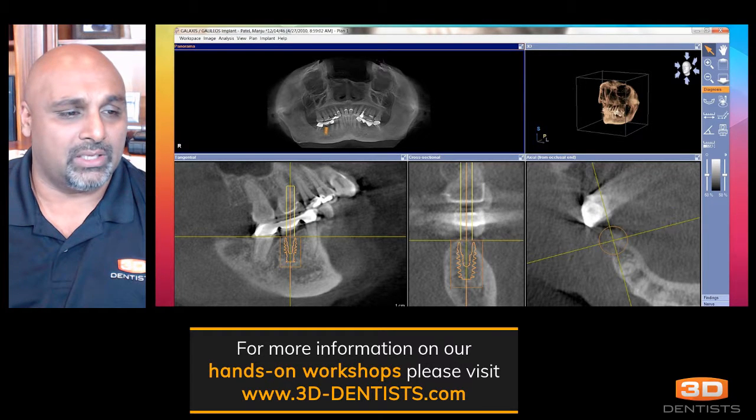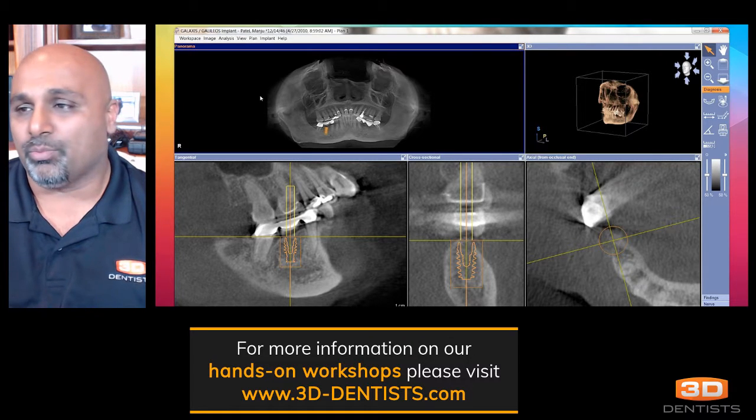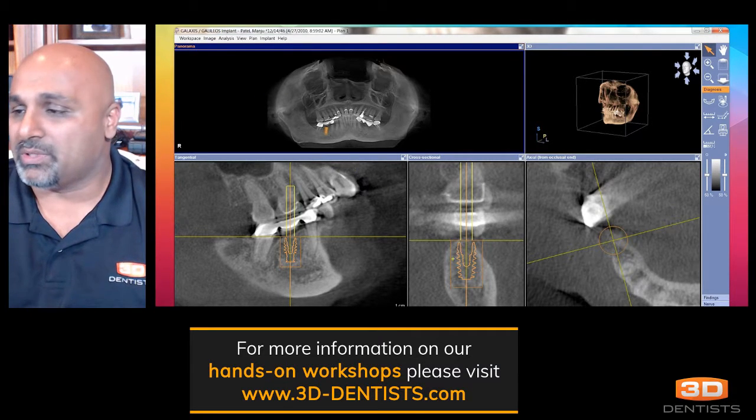Oftentimes we look at this from a singular perspective, and in looking at it in a singular perspective, we're not seeing everything. So if we were to take a look at this, what we would see here is an implant that's well placed within the bone.